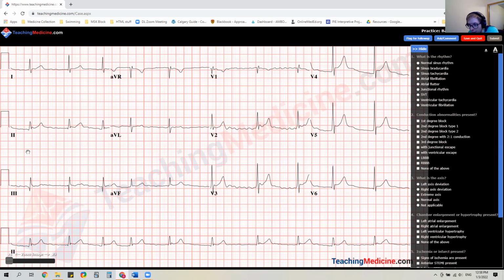It's fine. ST elevation in all 3. T's are normal. Anterior. ST elevation, elevation, elevation, but man, these are really high. So it's elevated. There's no Q. The T is upright, but it's concave and spiked.